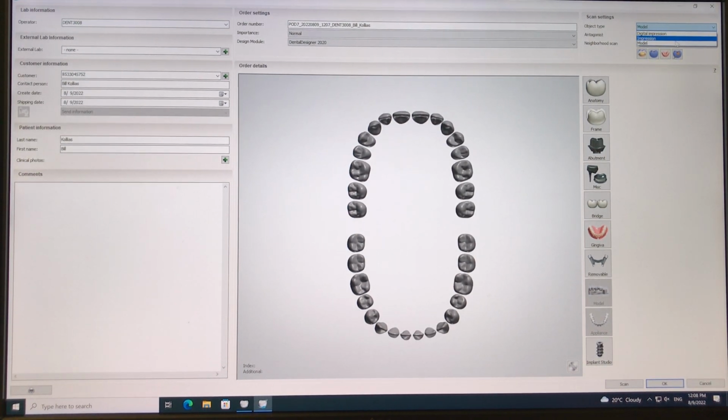You can also scan an impression, and we can also scan a model, and that's what we're going to do today. And this is probably the best way to create an accurate virtual model of what you are trying to produce. Needless to say, the virtual model that we're going to produce here is only as good as the impression that we've taken or acquired from our patients and the master models we've produced. So whatever we input into the system, we're going to get out of it. So nothing magical happens as we're working through this. It doesn't correct for any clinical errors or any laboratory errors required prior to creating a work order.